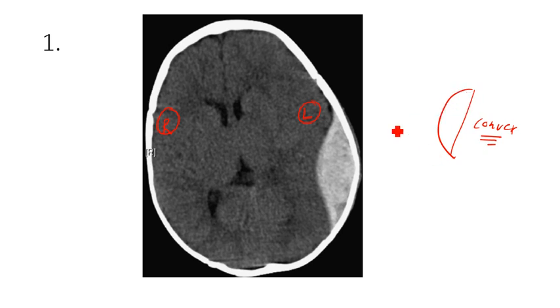Are you seeing that convexity? Hyperdense lesion in the temporoparietal region. That's the frontal, that's the temporoparietal region, and this is the occipital area. So in the left temporoparietal region there is a hyperdense lesion, and this, ladies and gentlemen, is what we call an epidural hematoma.